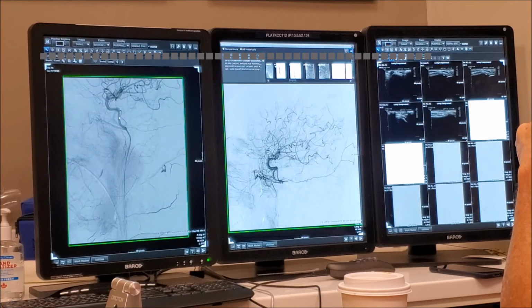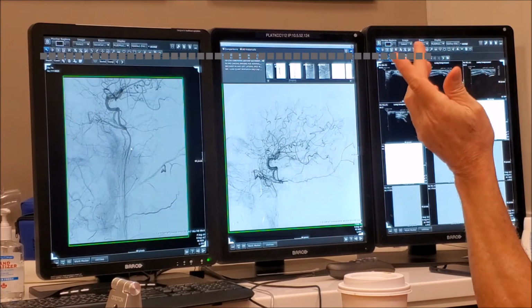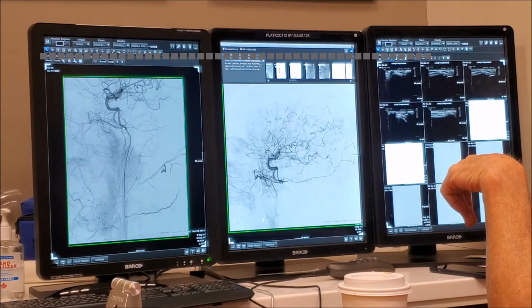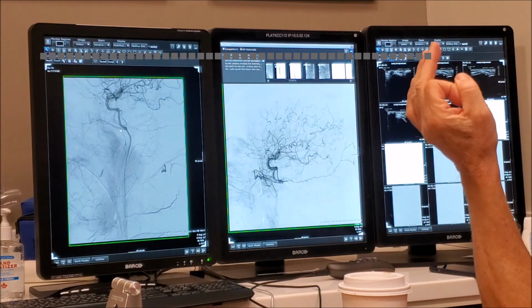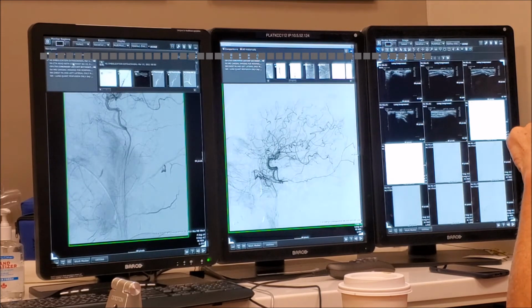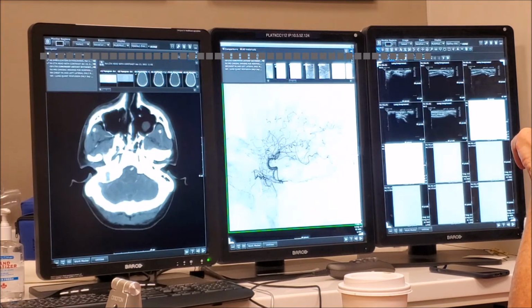Okay, we know this is the carotid or the continuation, right? And we know the ascending pharyngeal artery will give the artery to the foramen lacerum. So maybe this is what this is, and then it reconstitutes the carotid. That usually comes at C5. The foramen usually comes about this level. So this is coming through the carotid canal, which we know is small, right? But it's existent. Okay, let's see the CAT scan. Let's see it with only bone windows. Let's see if we can see. There should be better.